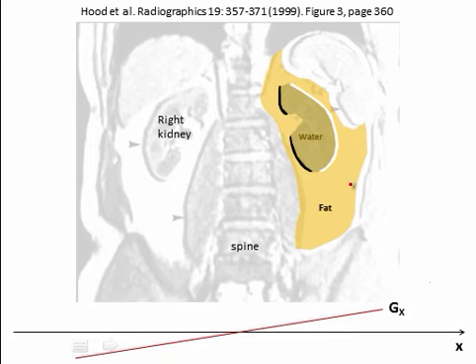So remember, the chemical shift is the shift of fat relative to water. So if fat is surrounding an object of water, then when it moves into it, you're going to see a bright band, where the bright band is the signal.